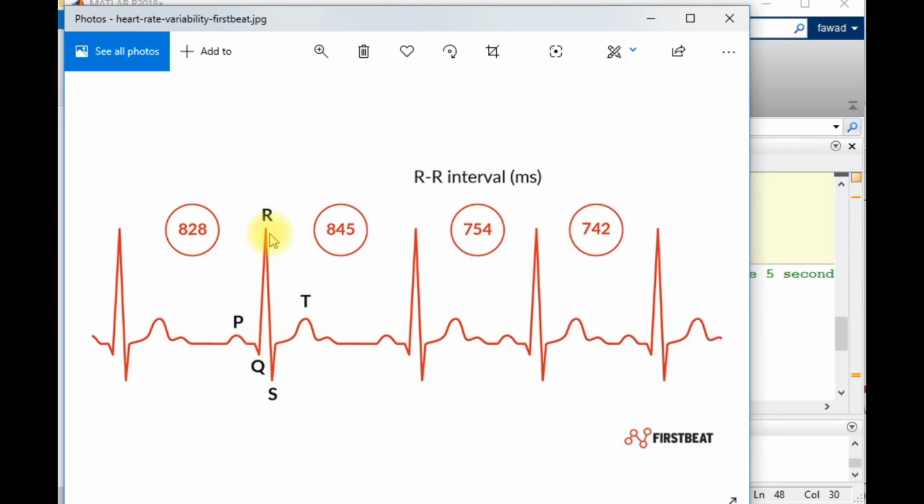The amplitude of this peak is very high, so I have tried to localize these high amplitude peaks within the complete cycle, so that I may localize these beats within the complete ECG. The number of these R waveforms in 1 minute will show me the heart rate of that patient. So the main focus of this code was to localize these R waveforms.